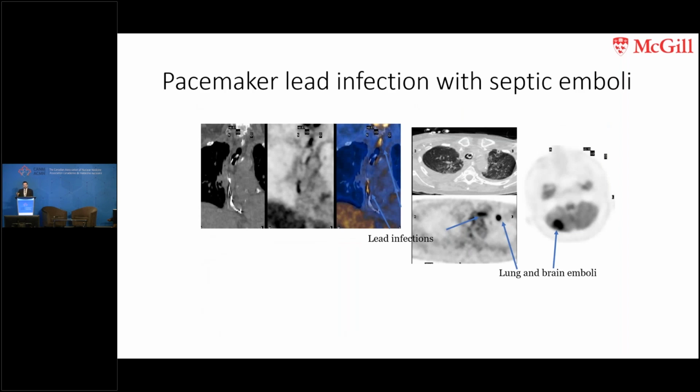In this patient with an extensive lead infection on the right that you can see with the arrow, the patient is intubated in the ICU, but we can also see that there are lung and brain emboli.